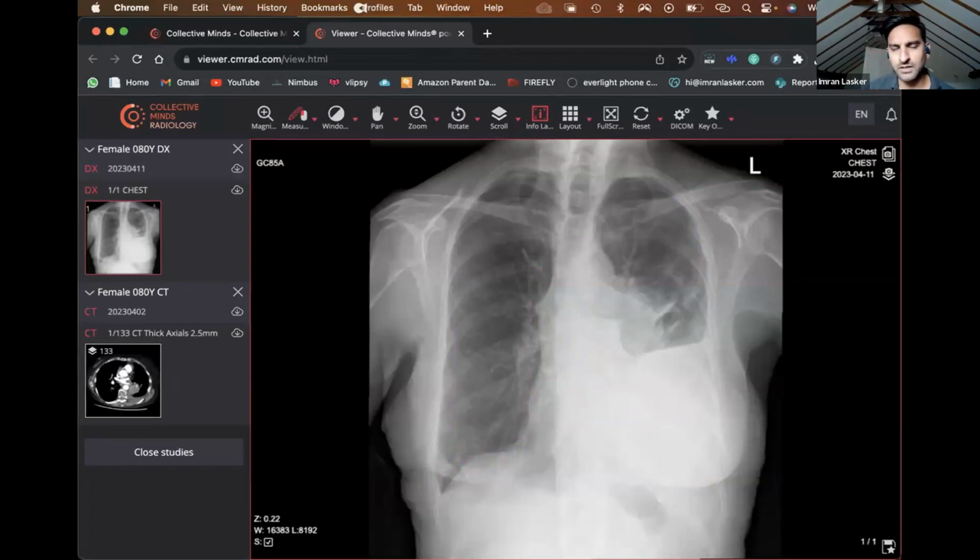So we've talked about consolidation versus pleural effusion before. But for those that don't know, when you're looking for consolidation, you're trying to see whether there are any branch-like areas located over here and over here. If it looks like a branch, it's essentially like a straw within a glass full of water. You've got a straw, which is like the airway, and around it you get a whole lot of gunk. That's probably going to be consolidation.